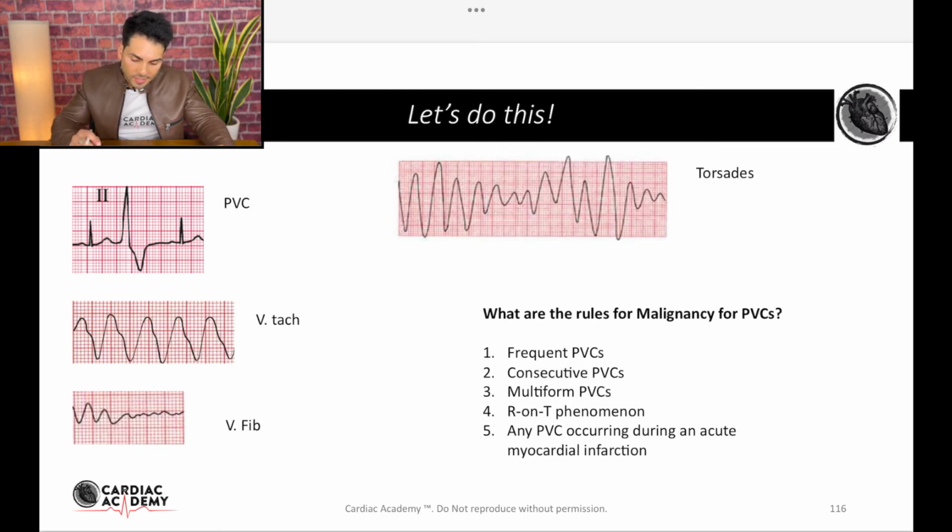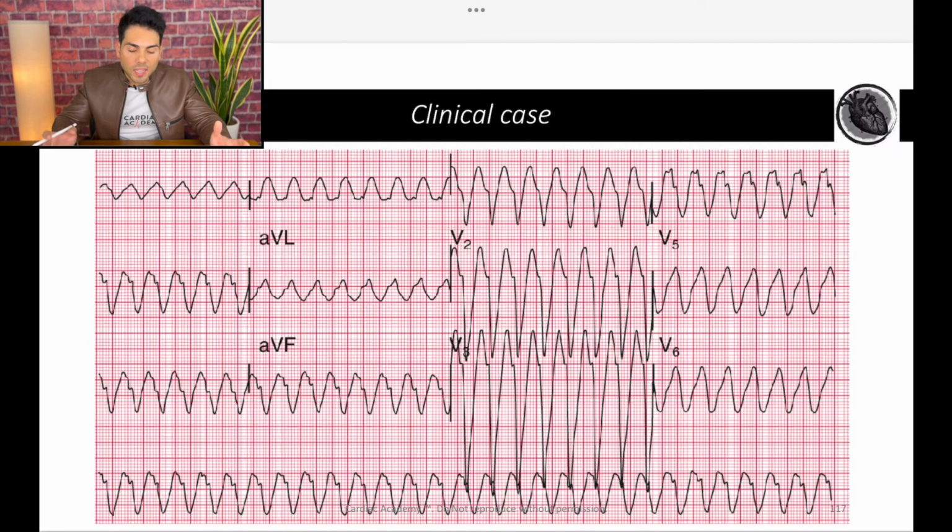Excellent. All right, so just looking at this EKG, what do you think is going on here? It's a wide complex QRS, same morphology, right? It doesn't vary, so this is monomorphic V.Tach. Is it sustained versus unsustained? Well, here we have 10 seconds, but my guess is this is probably sustained. We just have only evidence for 10 seconds, okay?